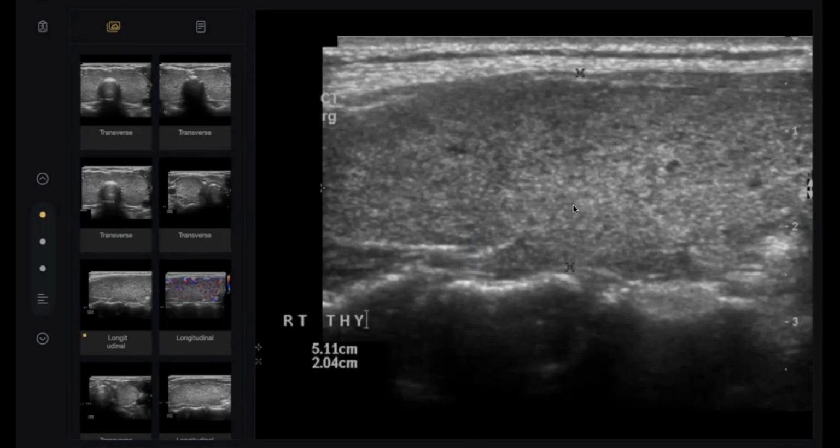Another question: how is it homogeneous? It looks heterogeneous. No. Doctor, this is a harsh image. What do you mean by harsh? It is the type of ultrasound. Siemens ultrasound gives the same harsh image. What does harsh image mean? The image is not soft.